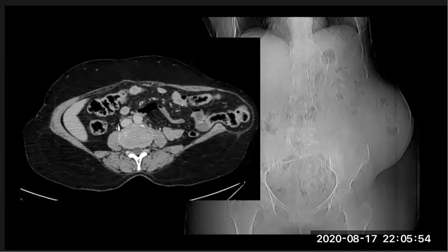Petit hernia. It is Petit hernia. Okay, very good. And the superior one, can you remember the name? I'm not sure, the name is difficult. Okay.